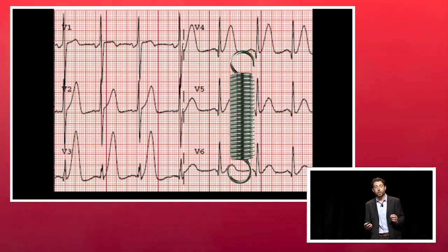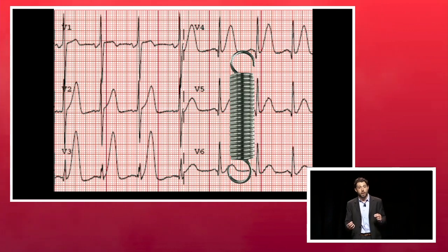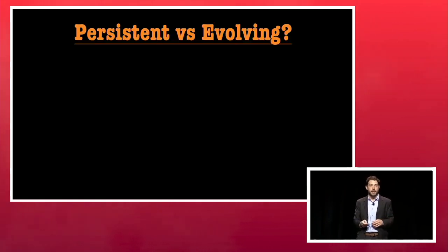Remember the concept I told you about the QRS complex being like a spring, right? Under some normal circumstances, you could imagine that in V3, if you had an S wave that was pulled way down, maybe it'll snap back and give you a big T wave like that. However, in this case, that QRS is tiny. It should not be able to generate a T wave like that. This is clearly pathologic, okay? Kind of violates that principle.